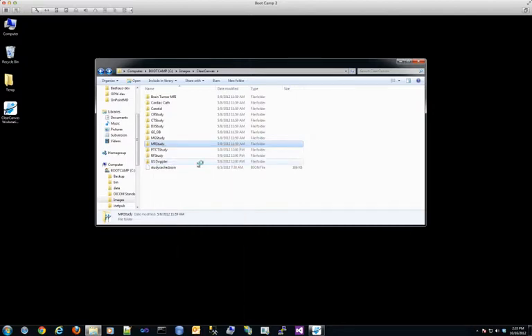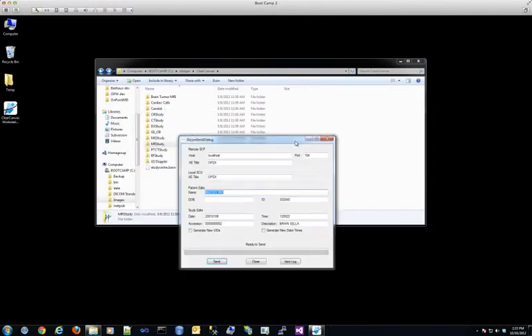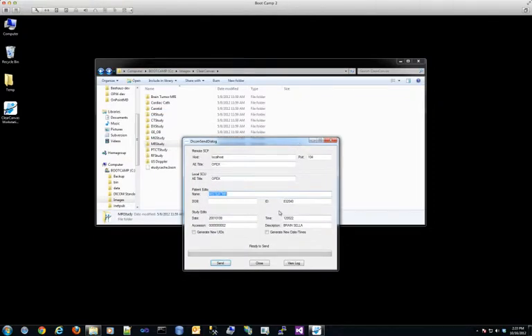Once you select it, it will scan that directory and pop this dialog up, which allows you to set various options for the send. Specifically, the network and AE title parameters. The first one is the host name or IP address of the SCP, like the PACS server or the archive that's listening and receiving DICOM. Then the TCP port number it's listening on, the AE title that it is known by, and you can also specify your local SCU AE title that you send over when you negotiate the transfer.